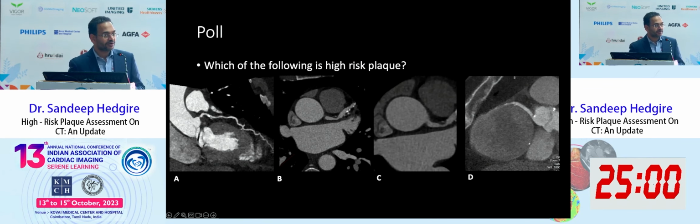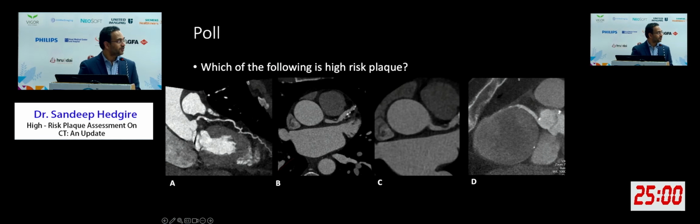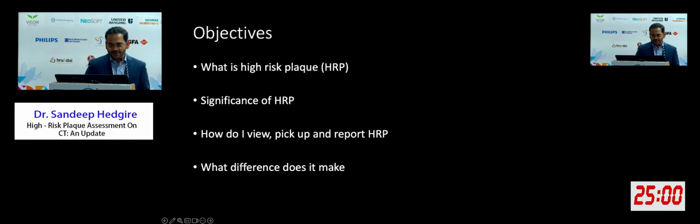But first, I would like to begin with a poll. There are 4 images shown on the screen, A, B, C, and D. How many people think A is high-risk plaque? Please raise your hand. Nobody? How many think B is high-risk plaque? Raise your hands. A couple. How many think C is high-risk plaque? Okay. How many think D is high-risk plaque? Okay. We'll come back to this poll, but keep your answer in mind.